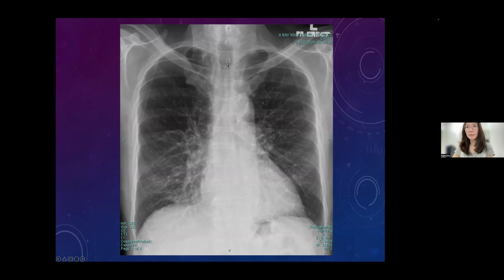So going through the mediastinum, paratracheal region, okay. And then the mediastinum here is fairly normal, right? No widening. And then the cardiac silhouette is also preserved. But look at this aortic arch here. It is smooth, it's normal. But then look above the aortic arch, there is a lesion here actually, hiding over the paraspinal region above the aortic knuckle. So this is a very subtle finding. Next I will show you his CT scan.